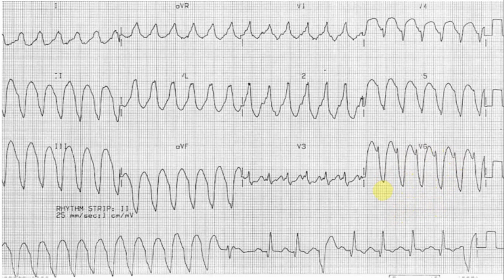Thank you. Excellent. That is another beautiful interpretation of this 12 lead ECG, and the patient has a VT, of course. The main characteristic feature that we look for is, first of all, wide QRS complexes. So we look at Brugada criterion number 1, which is the absence of the RS wave. But you can see that there is an R wave here, an S wave here, an R wave here, and an S wave here. So in the precordial leads, the absence of the RS wave is not fulfilled. So criterion number 1 is not there.